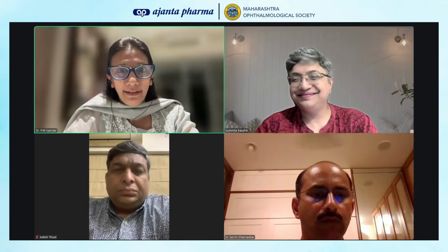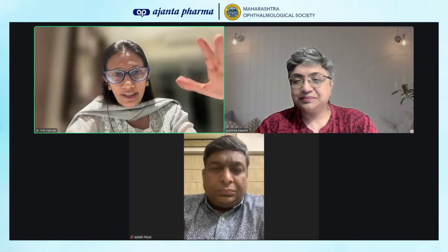So what Dr. Sushmita is trying to say is look at the raw data. Yes. And in that raw data, red is good. Otherwise, we are primed to think red is bad. But here is one place where red is good and blue is bad. So that's a very important thing which she said, that look at the raw data and look at the statistical data later. Sometimes you get those red, green, and you get lost in that sea.